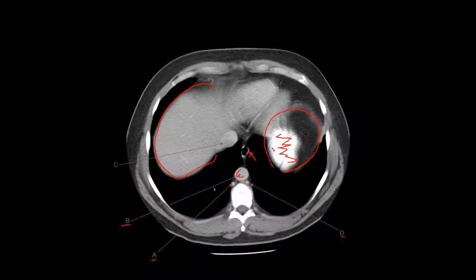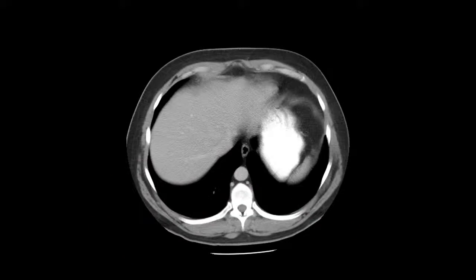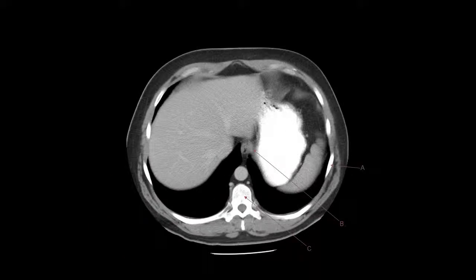The liver, and then C is actually really round as well. That's the vessel. That's your inferior vena cava coming up by the liver. Okay? Alright, so again, keep on rolling down the abdomen a little bit more. What do we see here?